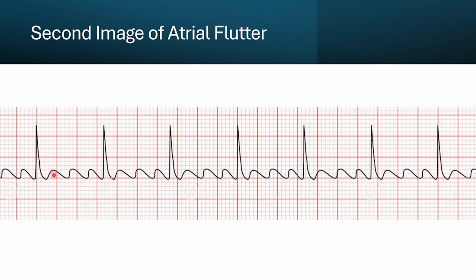So we can see here the atriums are firing off much faster than the QRS complexes are. But at the same time, while the SA node may be firing off, causing the atriums to contract, the ventricles, due to the AV node slowing down the actual beat, are firing off at a decent rate. But over time, this can cause issues. We don't want the atriums to be firing off quickly because it might not properly perfuse the ventricles.